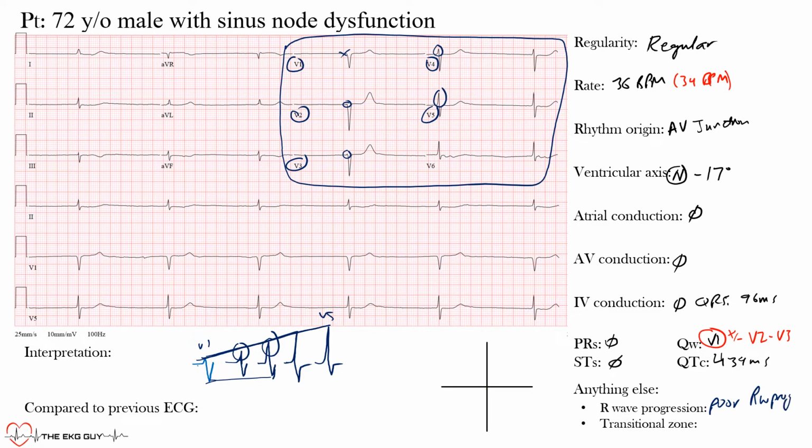All right, so hopefully that makes sense. And that can signify an anteroseptal infarct or something when you have those poor anterior forces that may be going on there. Okay, so we will get to that shortly.